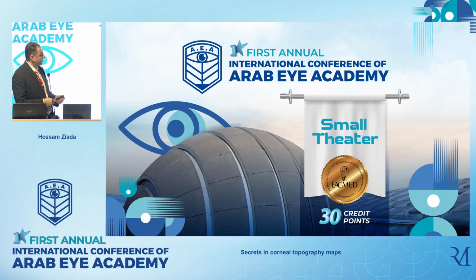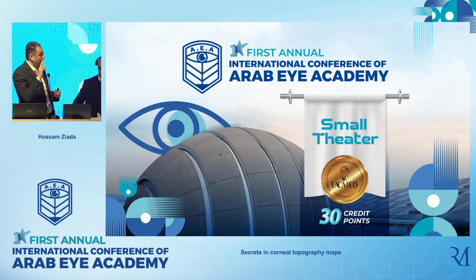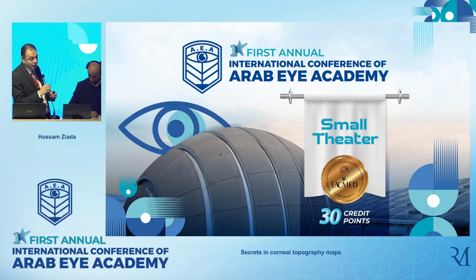So the message is to consider the back, to consider two things. Any difference between the superior and the inferior points in the anterior curvature map, whatever the difference, until explained. Also, the posterior curvature map is very sensitive, so for the very minute change, especially if it's inferior, you have to suspect, to increase your safety profile and to be sure about your patient, and you can go after that comfortably and safely to do any refractive surgery you like.